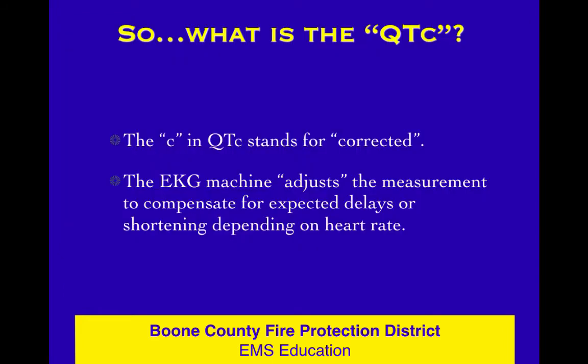So what's this C thing, the QTC? Well, I really wish it wasn't a C. I wish it was like A for adjusted, because corrected kind of gives the wrong meaning sometimes. It's a little bit confusing maybe. The C stands for corrected.